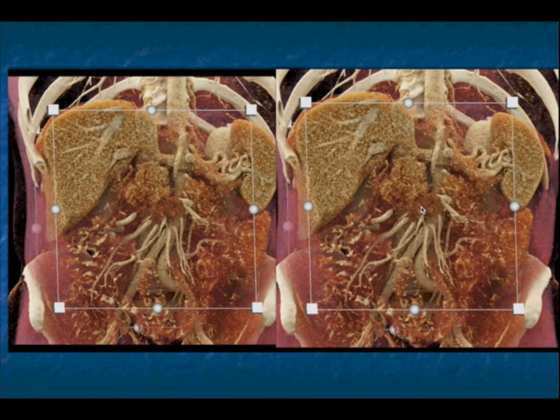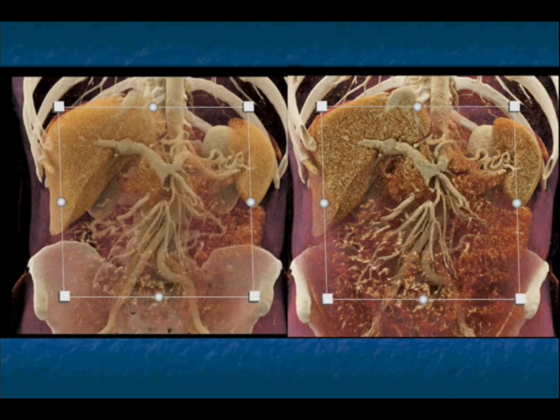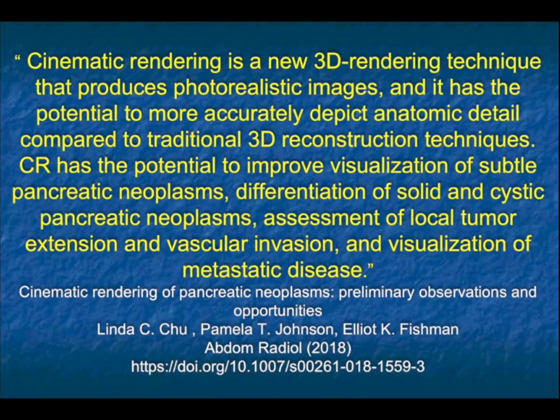And then you look at its involvement around the branches of the SMV, and we recognize that this patient, where you could have said get a 3 or 4 month follow-up, maybe it wouldn't have made a difference, but the patient has pancreatic adenocarcinoma with involvement of the SMV and branches off the SMV. Here it is when I change the parameters a bit. The SMV is essentially occluded by not a very large tumor, but by strategic location of the patient's tumor, very nicely shown in this example.